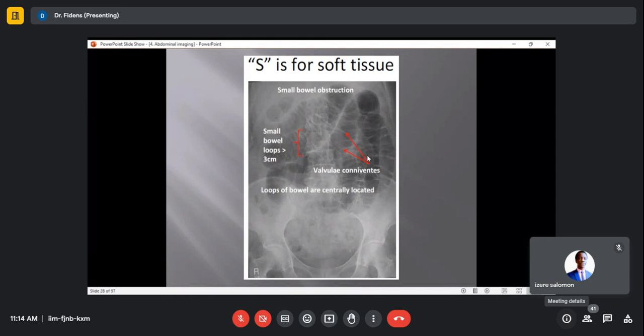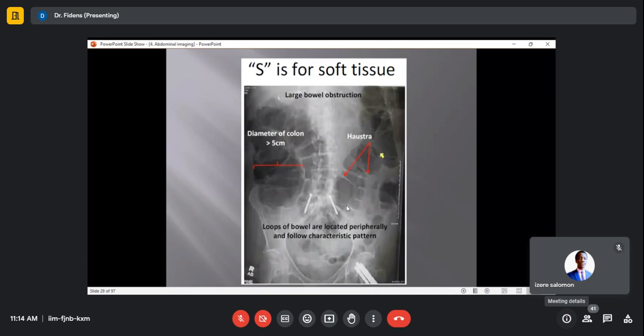Now let's see haustra. Look, those are haustra. Even this one, part of it is not crossing and reaching there. Even here, this is not crossing the whole diameter to reach there. No, it's just part of it. One third by estimation. Can you see the difference?